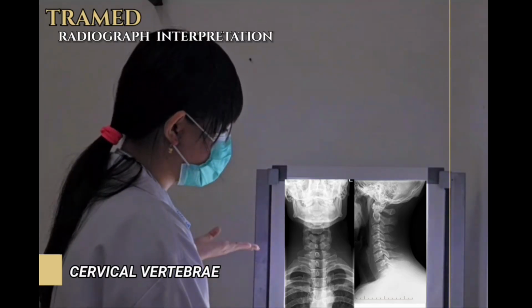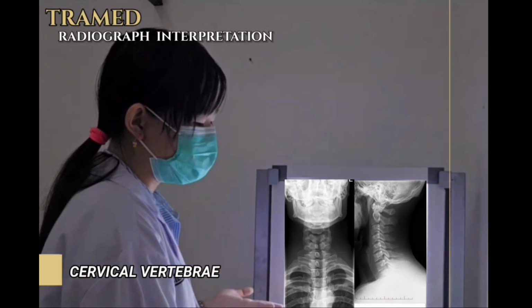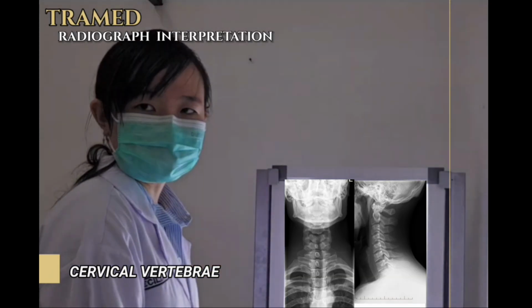And for the next, the facet joint is normal, and the surrounding tissue is normal. So for the conclusion, there is no cervical vertebrae fracture observed in the visualized segment. Overall, it's normal.